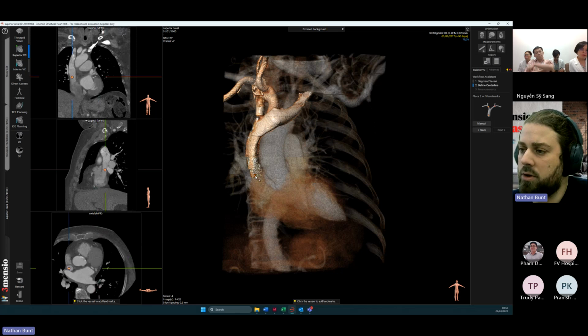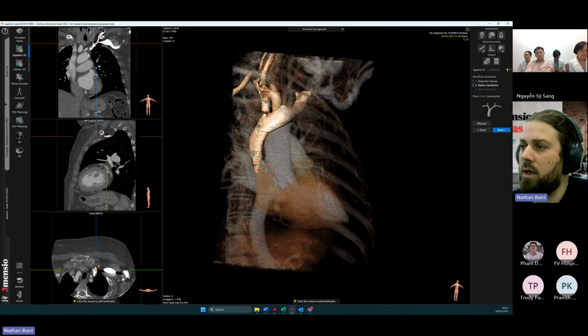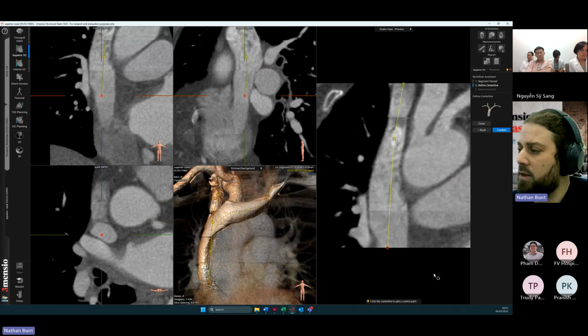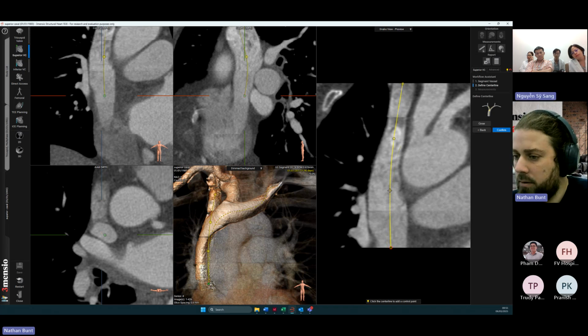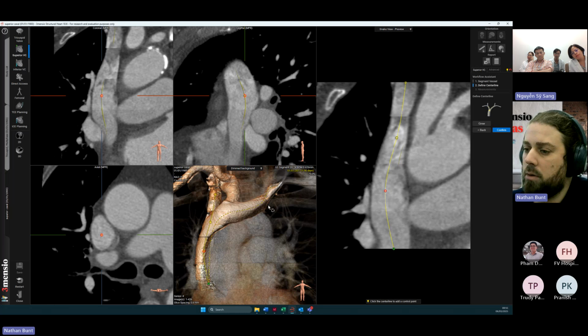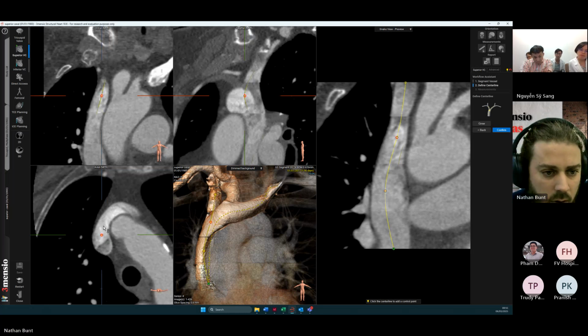We click once in the atrium or at the top of the atrium, and if we want to bifurcate the centerline, we can then also click in both superior vena cava arms to create a bifurcated centerline. The centerline can of course then be adjusted to our preferences.